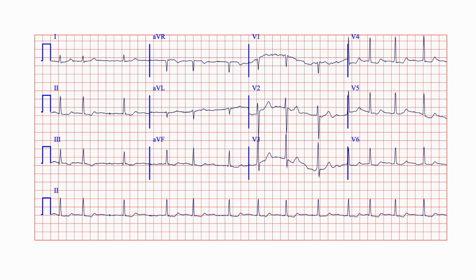So breaking this down, for rate, it's a bit hard to count between QRS intervals or R to R. So we'll go ahead and count across and we'll get 13 by 6, which equals about 78 beats per minute.